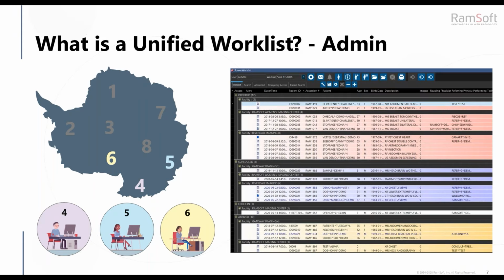It's very easy. For instance, a technologist is still dealing with a challenging patient, and the next patient is ready to be scanned. The next inline patient can be dragged and dropped into another tech's worklist. And of course, it's always courteous to inform the tech of this patient reassignment, right? They might still think this next in-line patient's on their list. And now this can easily be done with our secure HIPAA-compliant messaging.